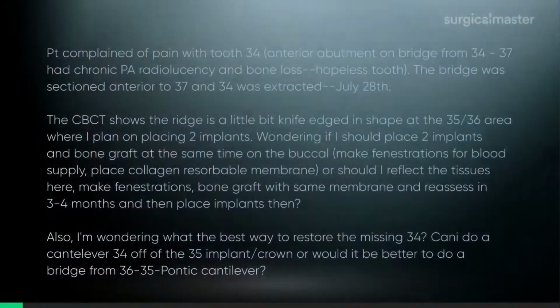This one I didn't review because I just got the photo. So this is a case of a failed bridge. I'm going to do it live with you guys.